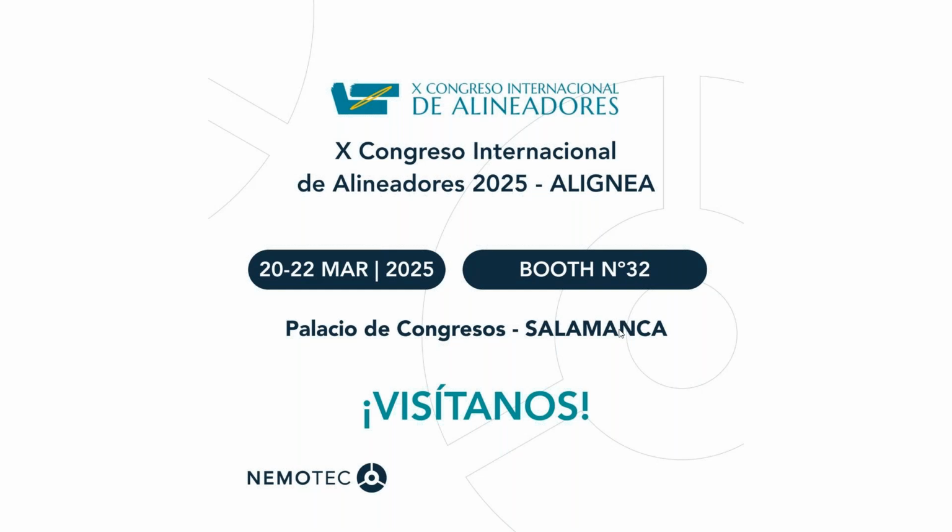And on today's webinar, we will be showing the full process of getting to know the aligner therapy in office. And we will begin now.